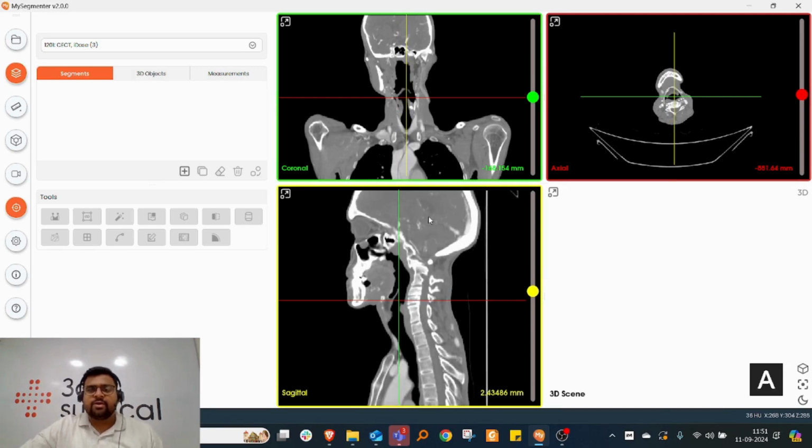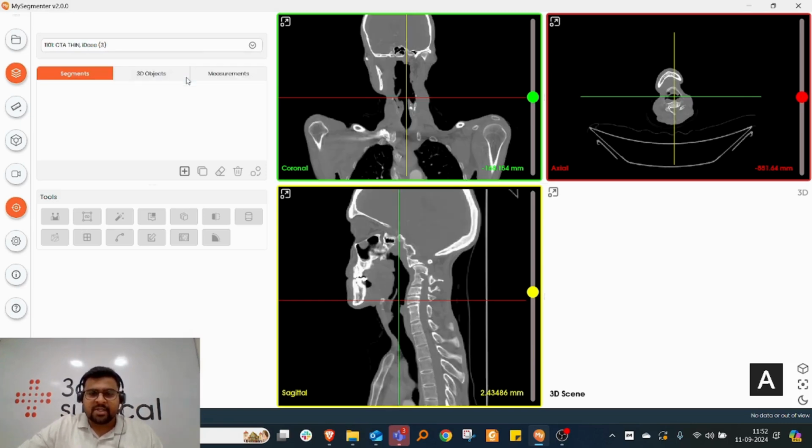So what we will do is, from the first image here, we will segment all the information in one mask with bone plus soft tissues and vasculatures, and then we will try to separate it and segment it where everything distinctively will be visible. So we will have the mask of arteries as well, and we will have the mask of bone and all. So first let us start with creating the normal masks.